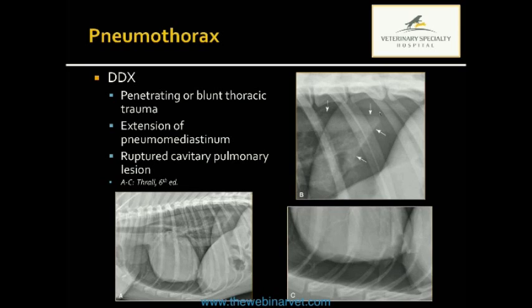That might include an abscess with gas-forming organism centrally. It might be a tumor, again, with a necrotic center. More commonly, we may think about bulla or blebs, which are purely air-filled cavities. Oftentimes, even if we do see those on the radiographs, we don't know who's exactly the culprit, but those are just some differentials to consider. And then our hallmark radiographic findings are going to be retraction.